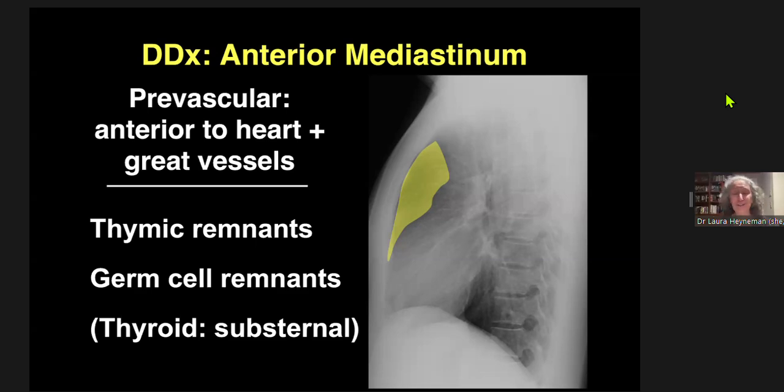The thyroid, as you know, is in the neck, in the paratracheal region. And as it grows, sometimes it can extend into the thorax, into the retrosternal anterior mediastinum. So I put that in parentheses because you generally don't see anterior mediastinal thyroid lesions unless it's very clear that there's thyroid pathology more superiorly and involving the paratracheal middle mediastinum, which we'll get to in a second.